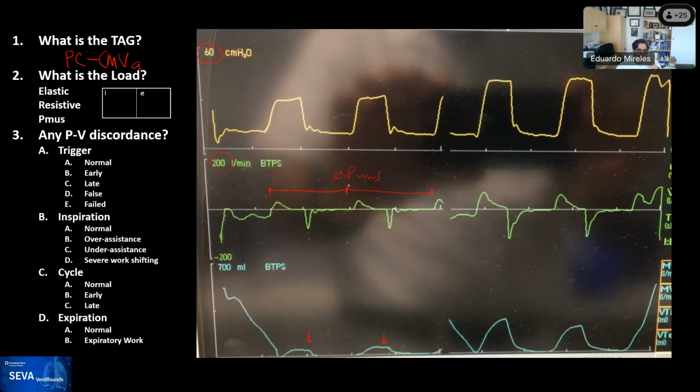Rob, these two breaths. First of all, if the patient's biting the tube, that would be a resistive load, right? A high airway resistance in the upper airway. Well, that's if not occluded completely. But that can happen if you bite the tube. The other thing is if they're breathing out, I would call that a PMUS load. It's just not in the usual inspiratory direction. Yeah, but so you cannot see if PMUS is fighting against Pvent, and that's why you're not getting any tidal volume.